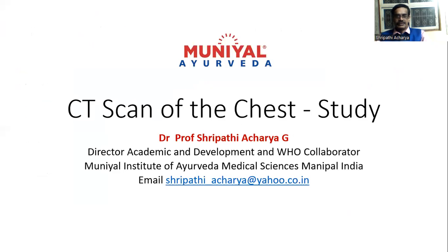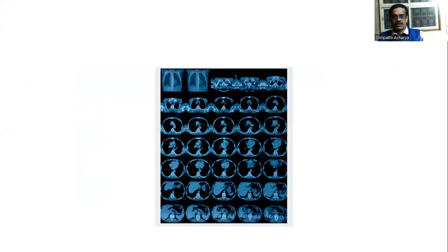Today's topic is CT scan of the chest study. CT scan means the study of the body parts in slices. So, chest is studied here. The film of a CT scan of the chest has different levels. You can see the structures of the chest as slices of the body.